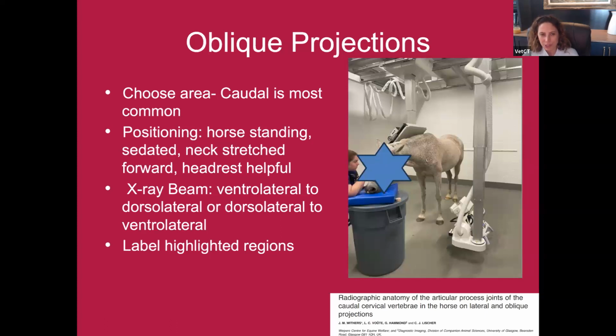Moving on to oblique projections. Again, these are a tailored part of my exam. I start with laterals and I'll add on obliques when I feel like it's indicated.